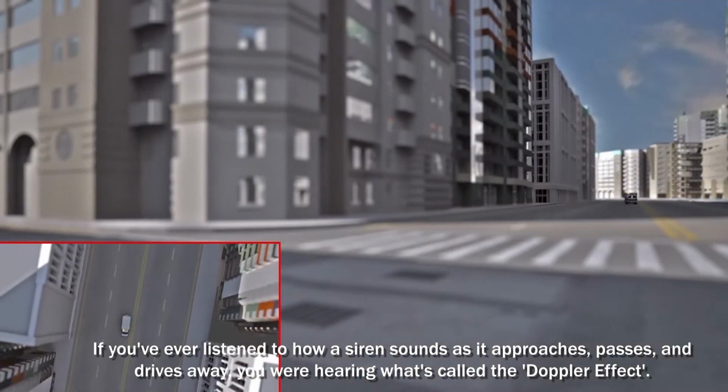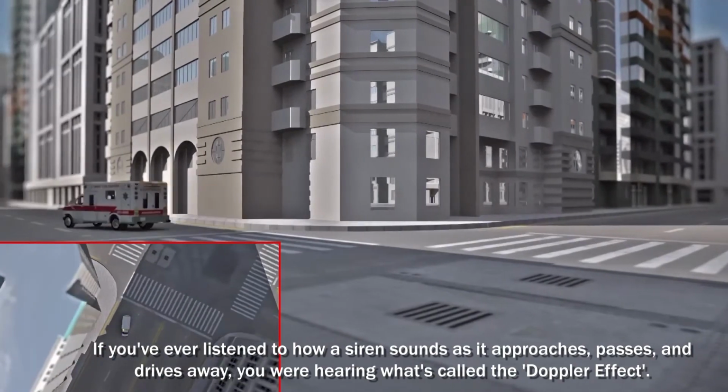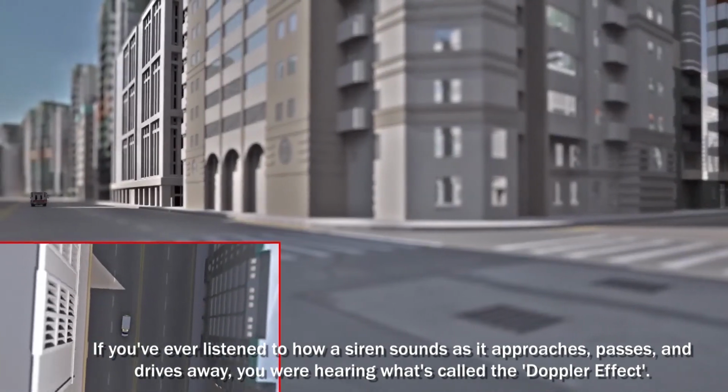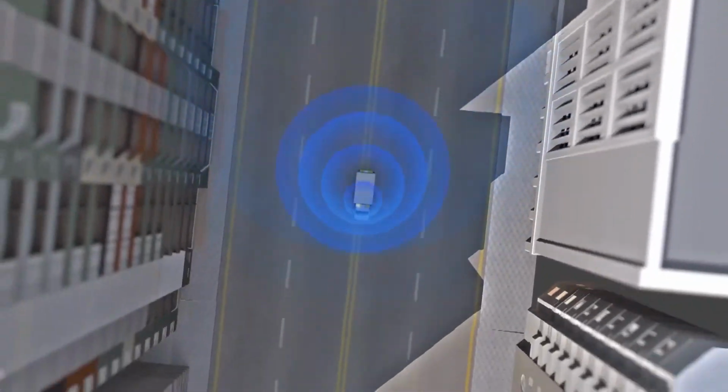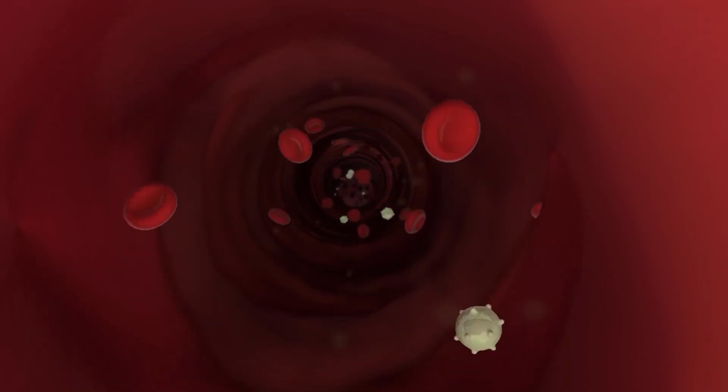If you've ever listened to how a siren sounds as it approaches, passes, and drives away, you were hearing what's called the Doppler effect. The waveform is compressed as the ambulance approaches, making it sound higher pitched, and it's stretched as the ambulance departs, making it sound lower. Doppler ultrasound uses the same principle to determine the speed and direction of the blood inside your arteries.